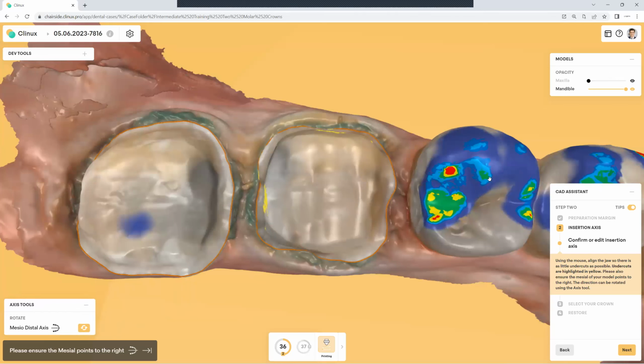Our idea is that you get through this, our software, as quickly as possible. Now, as you know, there's many ways to build contacts. You can use the form tool, or you can use the circular shape tool. It really depends on your own preference. Give them both a try. They work totally differently, right?